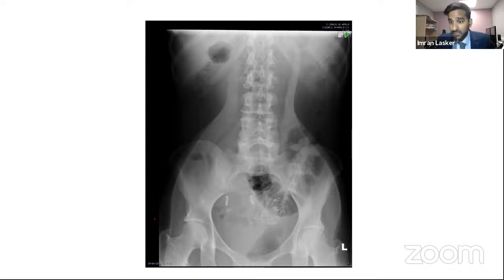Is it bowel? Could it be bowel? Can bowel go from inside, from all the way down here, all the way around like this, and all the way down there to down around the legs? It can't. So what else could it be? Could it be the aorta? Could the aorta be that wide and go all the way down like this, all the way around? Probably not. So now you've got a patient who's got abdominal pain and you really don't know what on earth you're looking at.